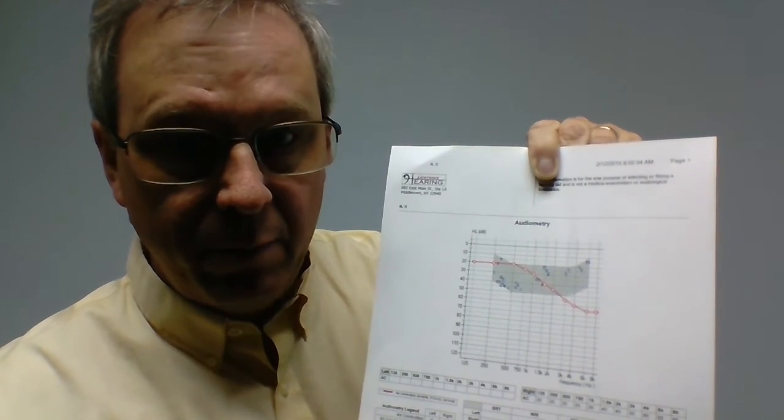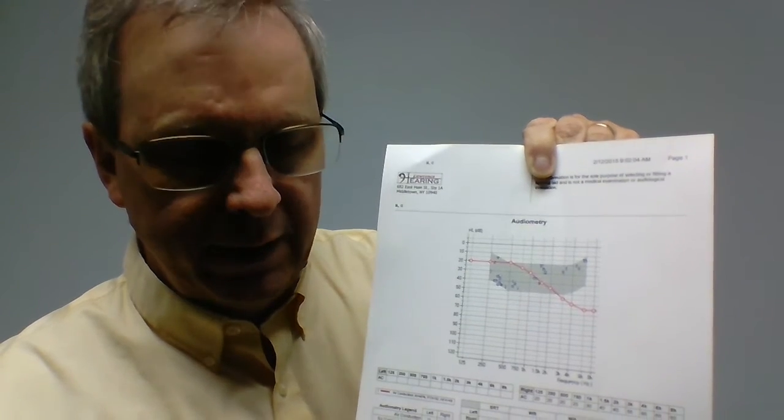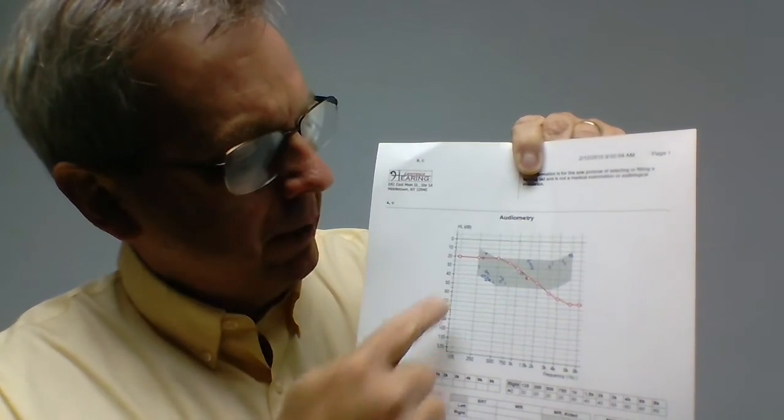So this is actually a pretty typical audiogram of a friend who walks in the office and says, I feel like I hear pretty well, but everybody mumbles. The reason he feels like he hears well is because he hears the low frequency sounds well. He has that good boomy lows, so he feels volume. But he doesn't understand speech, and he thinks people mumble a lot because he doesn't pick up the high frequency consonants in speech.